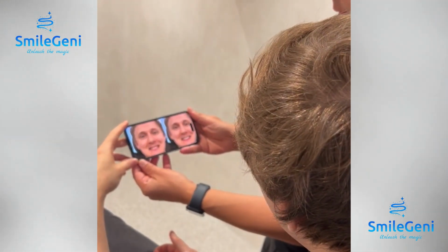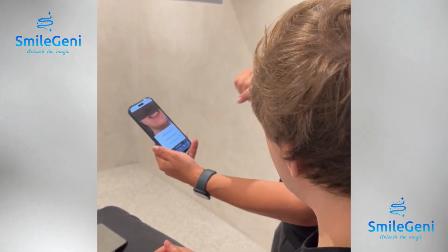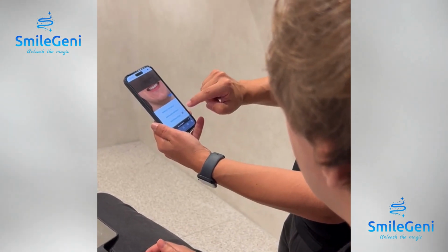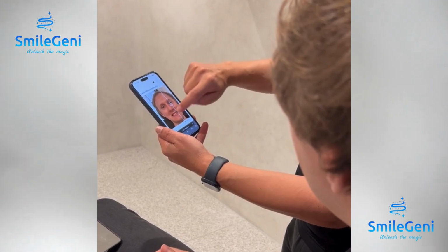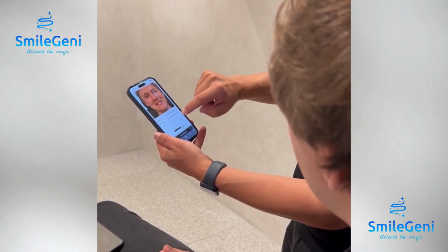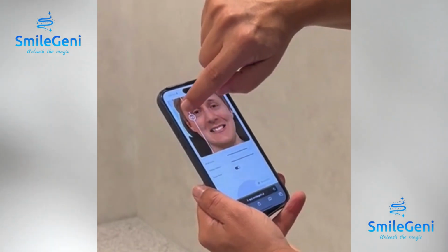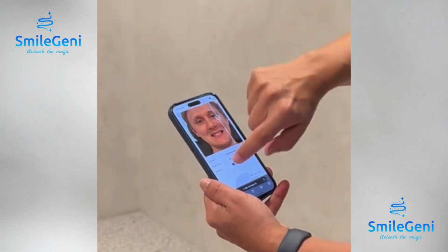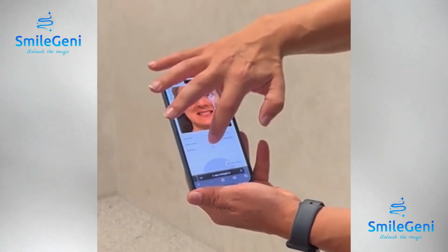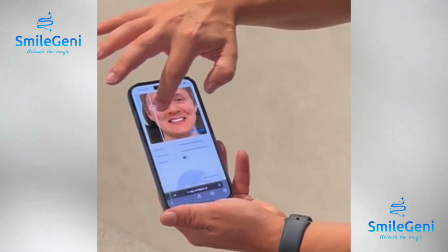Oh, wow. Now, what we can do, if we don't like it, we can improve the results. We can download it for you for your record. We can also engage and interact with the whitening studio that will show you what the result will look like. Yeah. If we whiten them as they are, and that's before, and that's the after result.